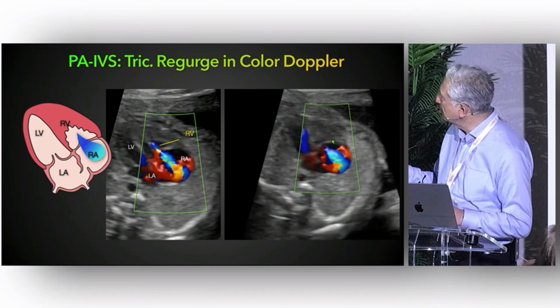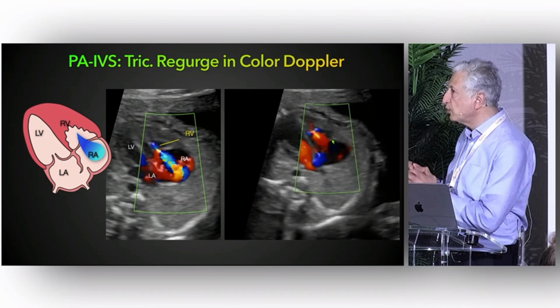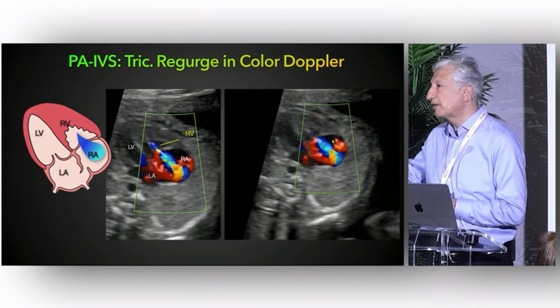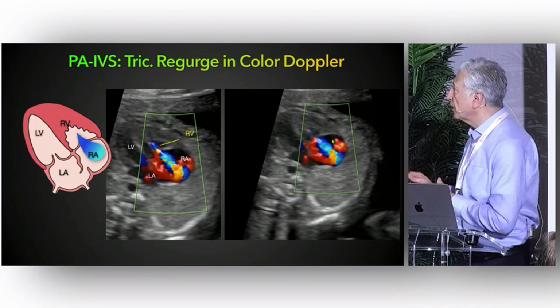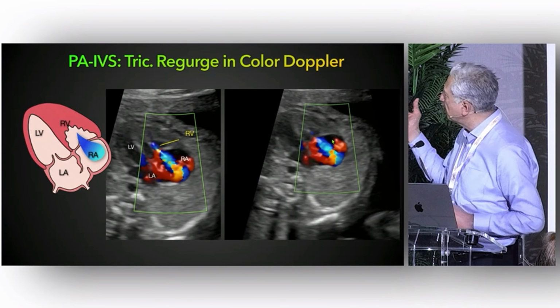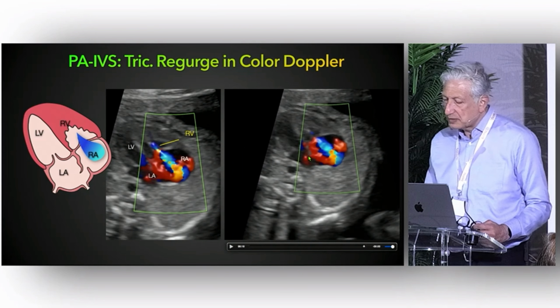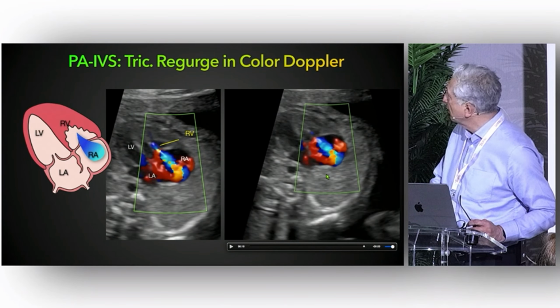And from this moment, you start having difficulties in getting to the diagnosis. Is it purely pulmonary atresia with intact septum, or is it already a tricuspid valve dysplasia? And there is a continuum between both. So I cannot give you a true answer what is the end, because sometimes you have the impression that the tricuspid is anyway dysplastic here, and you may call it tricuspid dysplasia, which is my talk tomorrow. But anyway, so this is the good way.